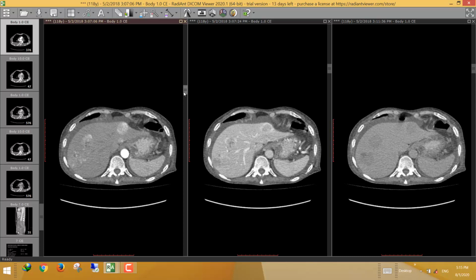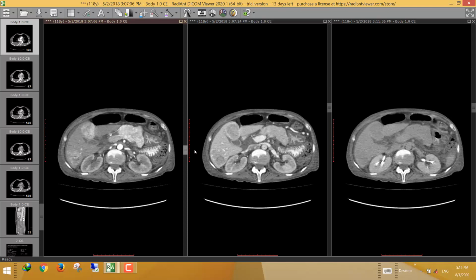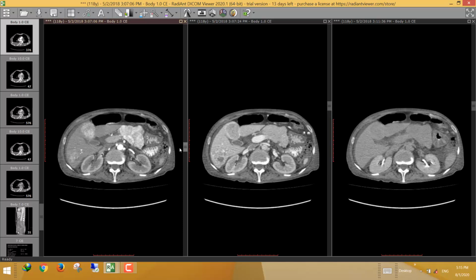Some types of thyroid carcinoma can send hypervascular metastasis. So in such lesions, if we suspect hypervascular metastases, you should look carefully at the pancreas, the renals, the bowel, and the uterus to exclude primary lesions. If we go downward in the images here, we can see a large mass lesion involving the pancreatic body and tail.